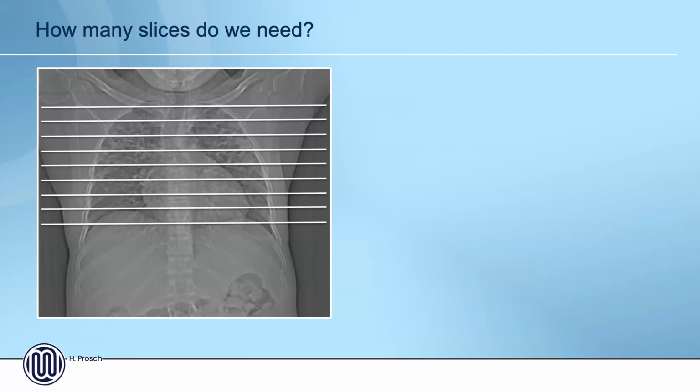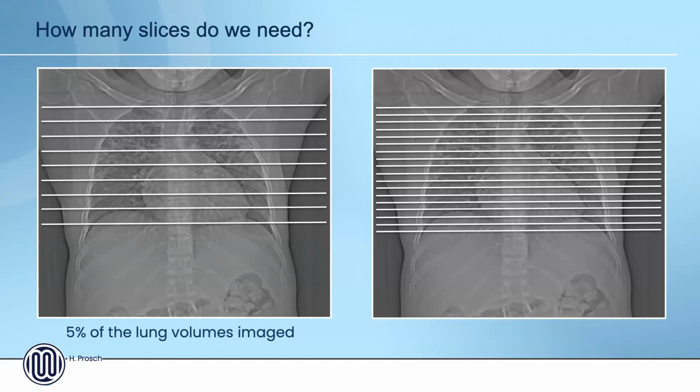And in order to make thin section CTs possible, they defined that in order to investigate patients with a diffuse parenchymal lung disease, it suffices if you are taking just a limited number of sections of a lung. So there are these thin sections, but taken in 2-centimeter intervals. That's what was done back then. But doing that, you were just able to image around 5% of the lung volume. There's another option to scan in 1-centimeter intervals, but still, there's a lot of space in between slices, and you're just able to scan about 10% of the lung volume. But this is what you call HRCT.